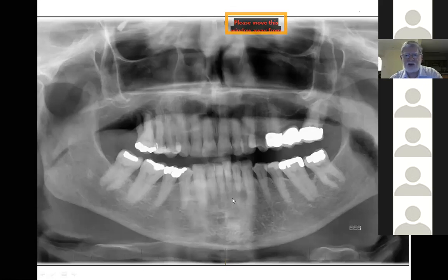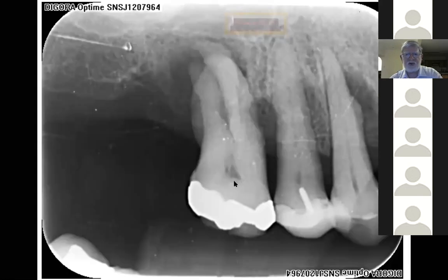But certainly when I'm seeing this here, we've taken a radiograph there, we've taken a radiograph there, and this is the first of them. There was absolutely nothing we felt we could do for the 6. It was so mobile.